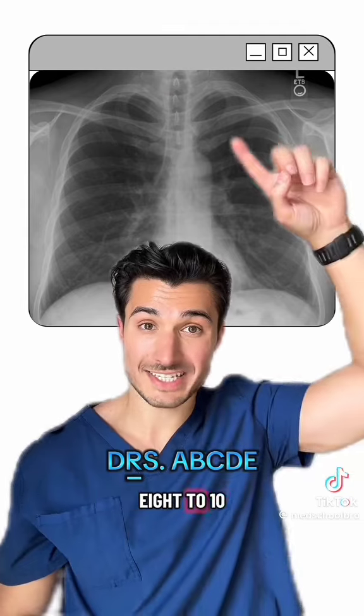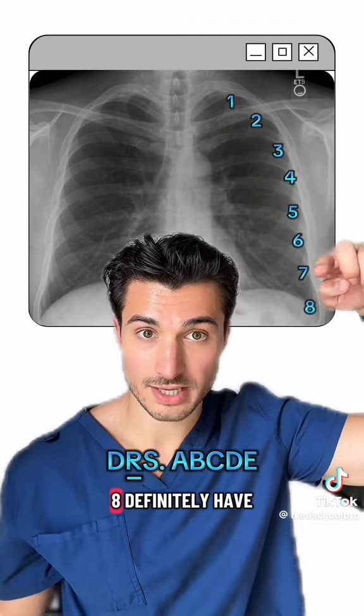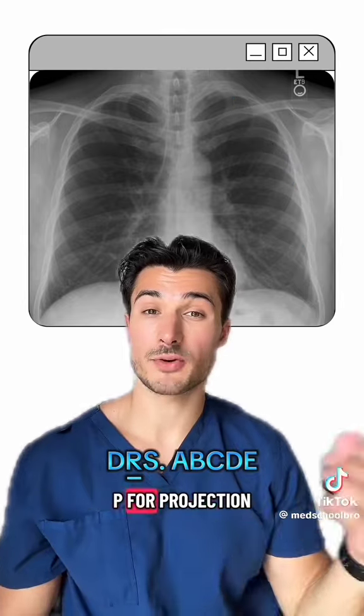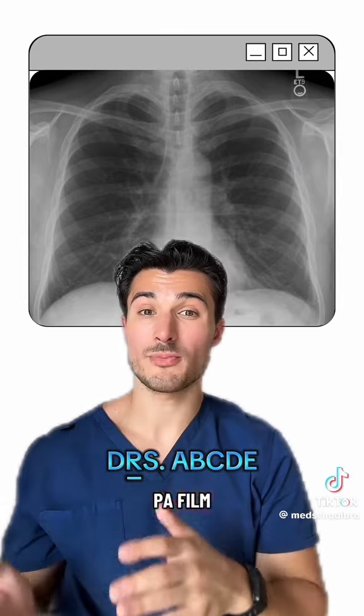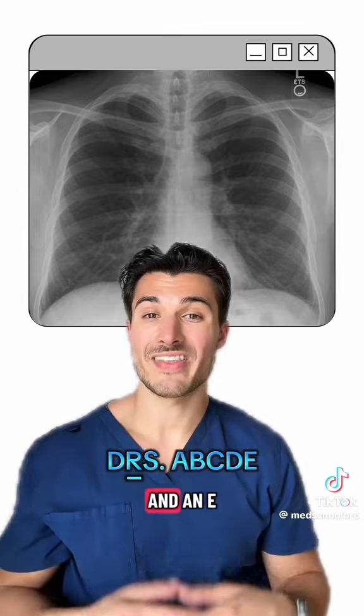Inspiration, so count 8 to 10 posterior ribs. 1, 2, 3, 4, 5, 6, 7, 8. We definitely have good inspiration here. P for projection. Is this a PA film or an AP film? Remember, in AP, the heart can appear larger. And then E is for exposure.